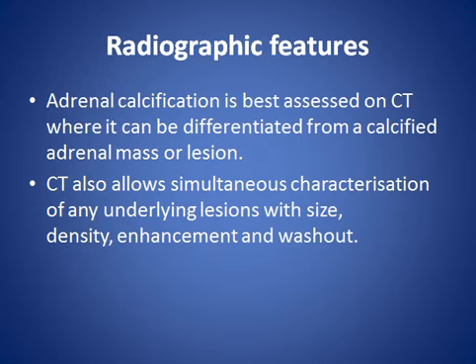Radiographic feature: adrenal calcification is best assessed on CT scan, where it can be differentiated from a calcified adrenal mass or lesion. CT also allows simultaneous characterization of any underlying lesions with size, density, enhancement, and washout.